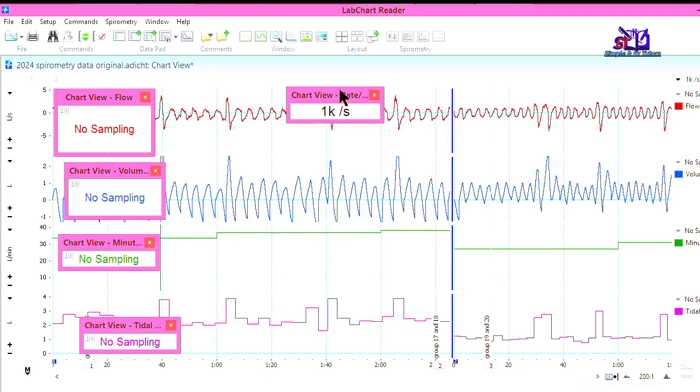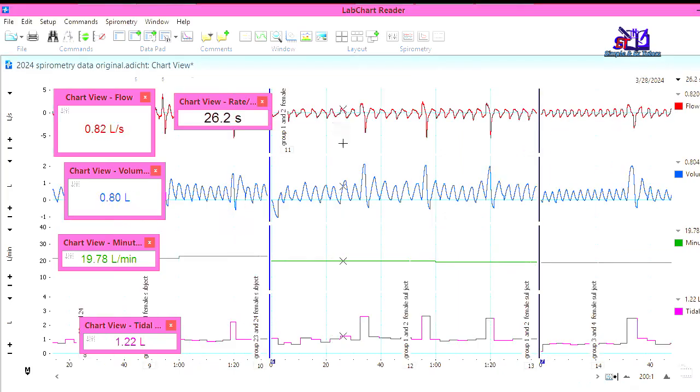So, and this is nice. First of all, we are going to be using an instrument called the marker tool. At the angle here, you can see this letter M is called the marker tool, which you can click on and drag onto your data on the wave here. If we decide to measure the inspiratory reserve volume, this marker tool will show us the difference between one point and another point.